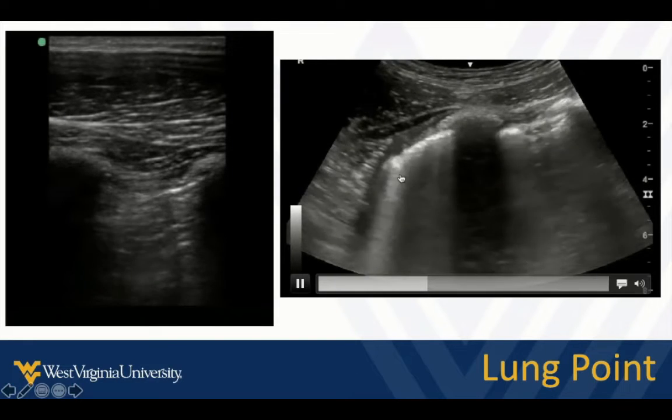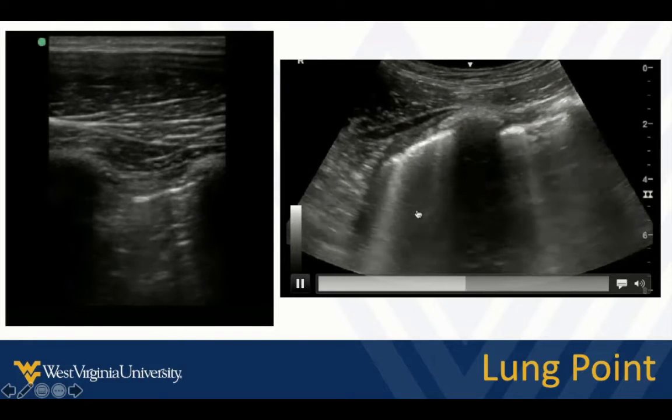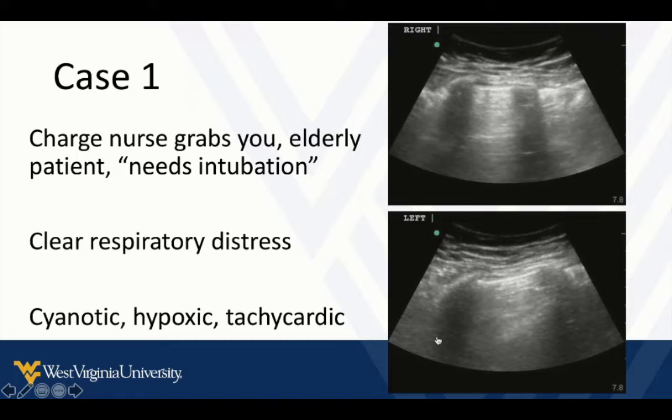Now in this case, we also see a little B-line or two. We're going to talk a little bit more about those coming up. So this brings us back and is relevant to the first case we talked about.